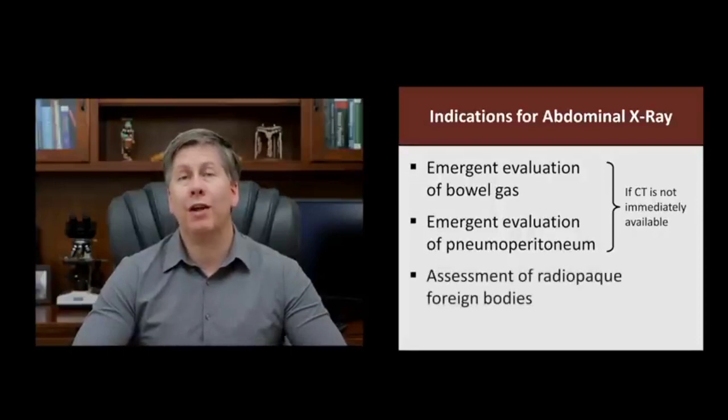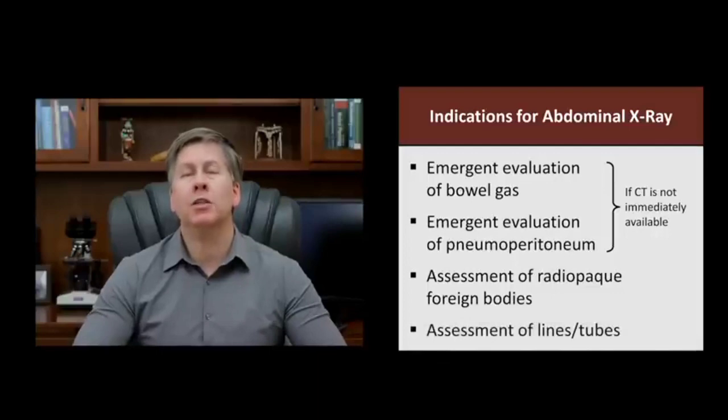When looking for kidney stones, non-contrast CT and in special cases ultrasound are the test of choice. Abdominal x-ray is generally performed here to see if you can see the stone, and if you can see the stone, the idea is that you can follow it up with serial x-rays. Now, let's move on to the actual imaging.